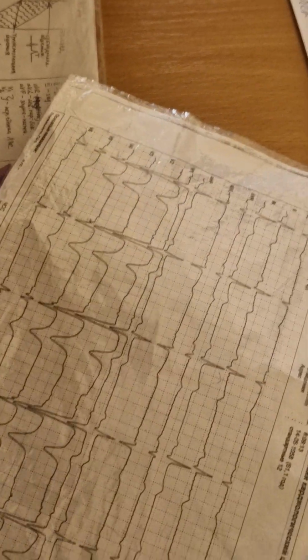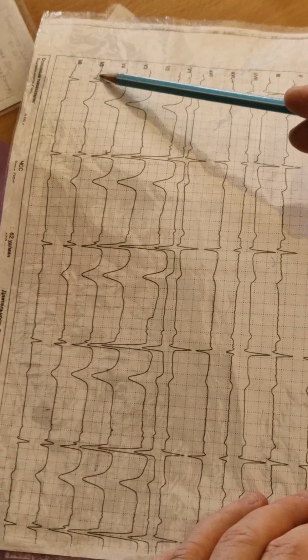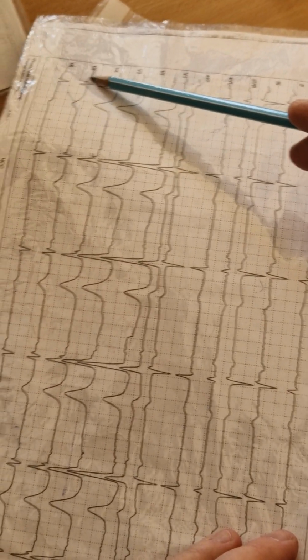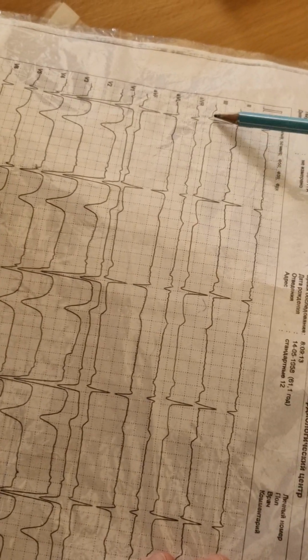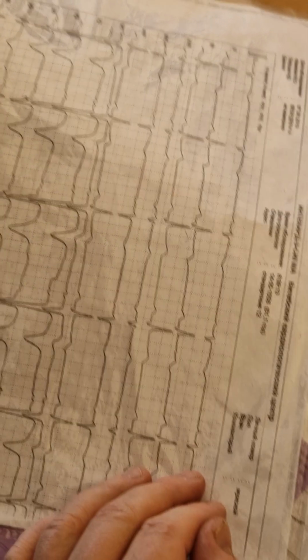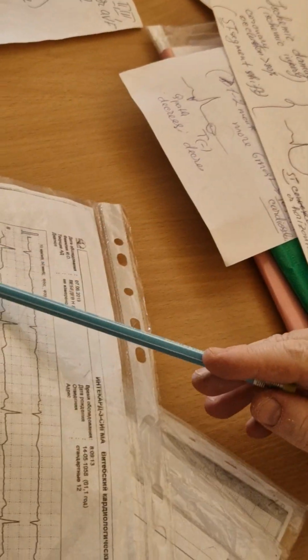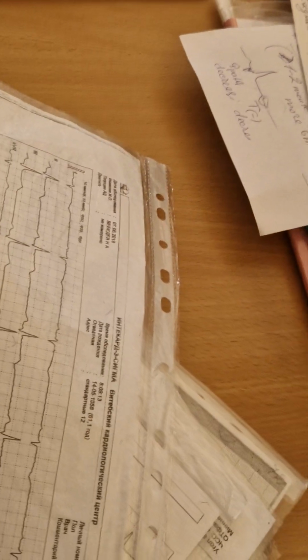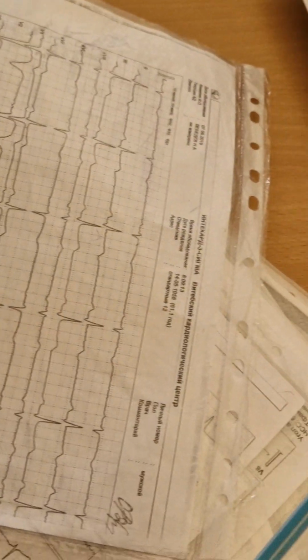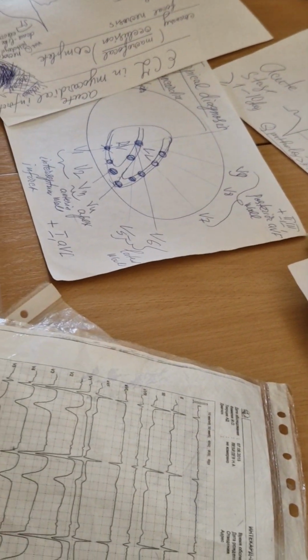And ECG. First is a typical infarction. To see: Q wave negative, and here the same widely. Normal Q wave only here. ST dome-like, T negative, usually on the second, third day of acute infarction. And you see 80% of infarctions involve the septum, anterior, apical, lateral wall of the left ventricle. Posterior wall is 20%, maximally.